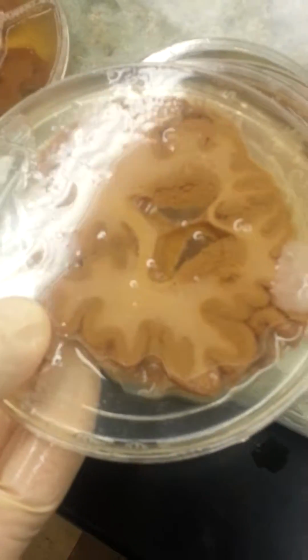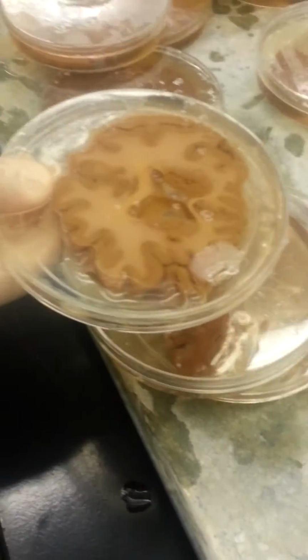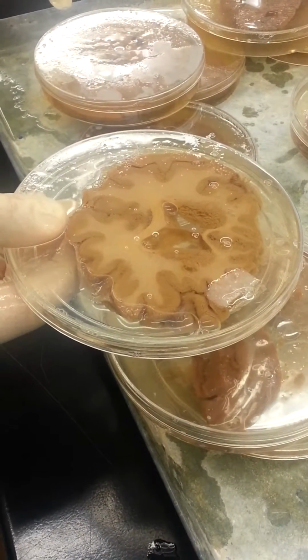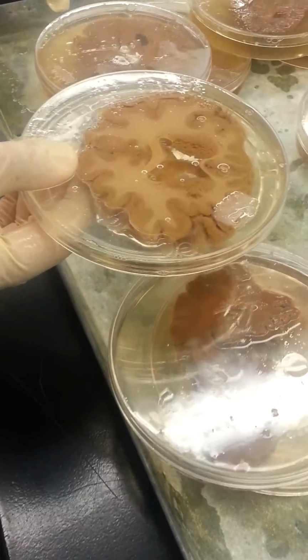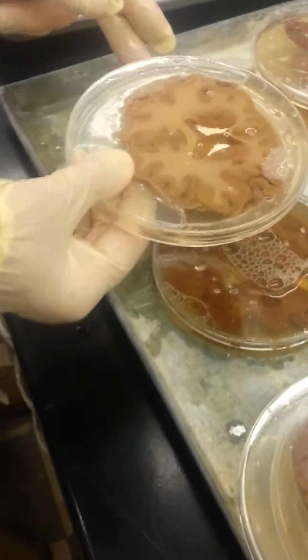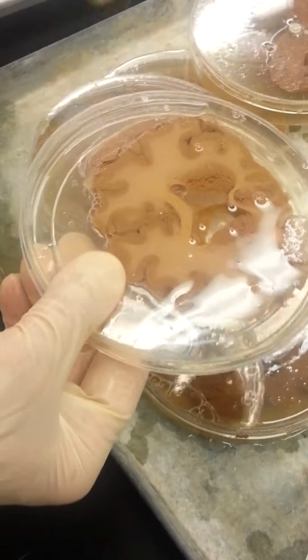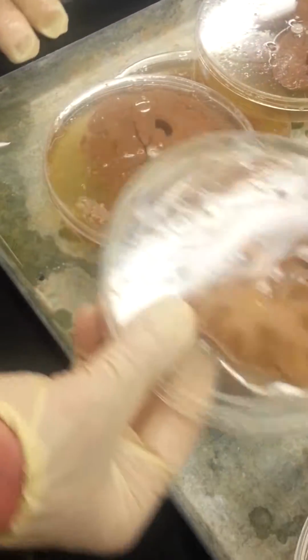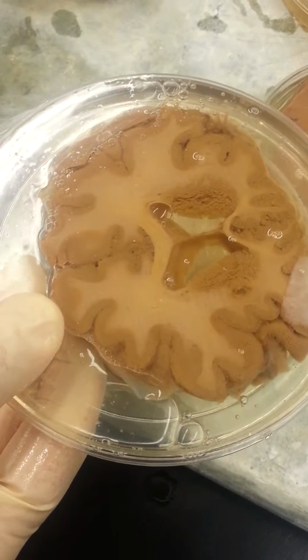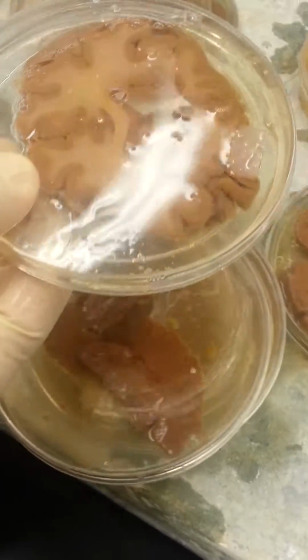This one, the relevant morphology that enables a person who knows about this to answer the question. Yeah, it's like a glare. Is more obscure, but I'm going to ask it anyway right now. Let's ask the easier question first. What is the relative position of this slice compared to the one we were just looking at? But don't answer right away.